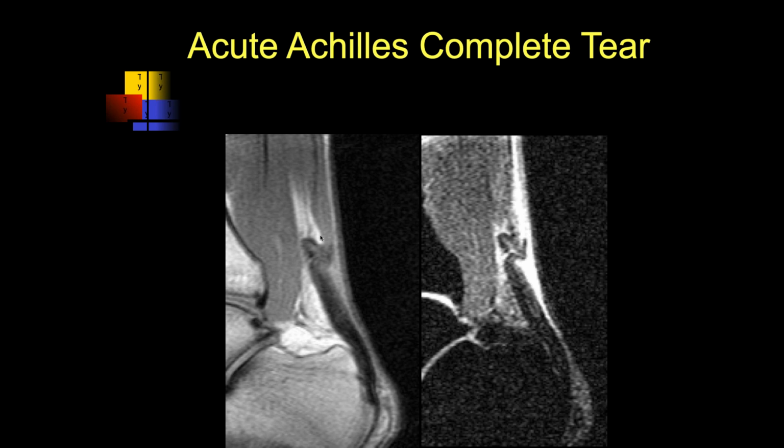It'll cause it to stretch, and finally it'll thin out and then pop. And that's what happened in this case. This you couldn't repair if you wanted to. That's the problem with this one. There's nothing to suture to above. This is right at the junction tear, and my suggestion would be to just leave it alone and cast it.